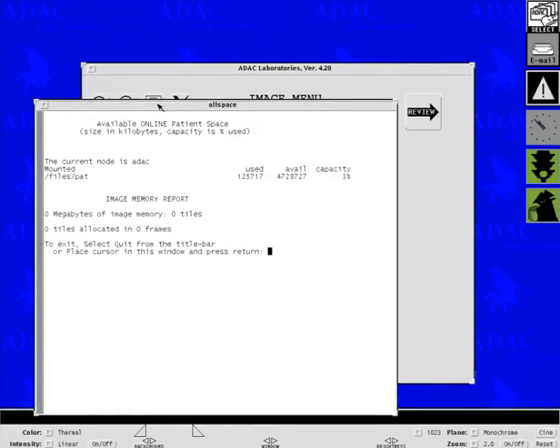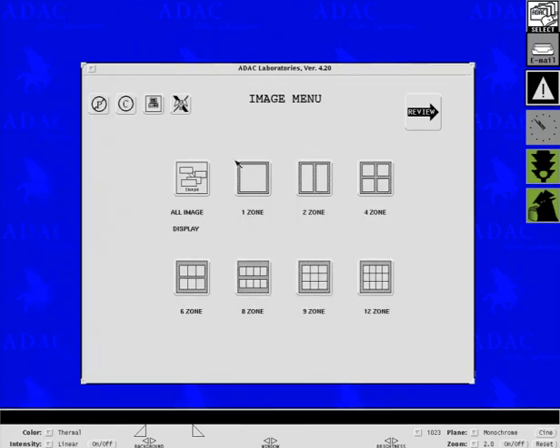This icon is telling me about my hard drive utilization as far as patient space goes. It does not tell me how some of the other partitions are operating, just mainly my patient space. Not really all that helpful in all honesty. There are a lot better ways of looking at this, but it is up there.